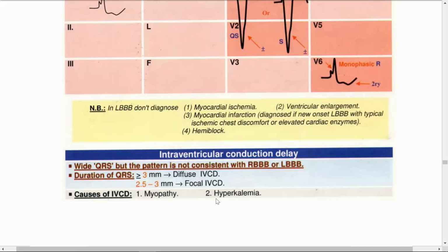Okay, let's continue. We'll take the ECG with the MI. So now we finished the atrial enlargement. We will look at V1 and lead 2 for both atria, and one sign is enough. And we finish the bundle branch block.